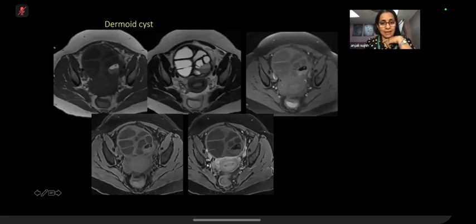Okay, so you've described it well. So here we have a multicystic, complex adnexal mass, which has predominantly low signal on T1 with focal areas of high signal, which is getting suppressed on T1 fat saturation. On T2, the fat remains intermediate signal. The rest is showing fluid signal. And there is no enhancement in the post-contrast image.